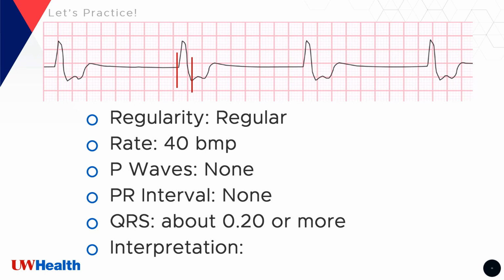And the QRS, depending on where you measure it, because honestly, that little hitch there behind the QRSs, there's my little marker, that little hitch there might actually be some kind of extra activity or something. Don't really know.